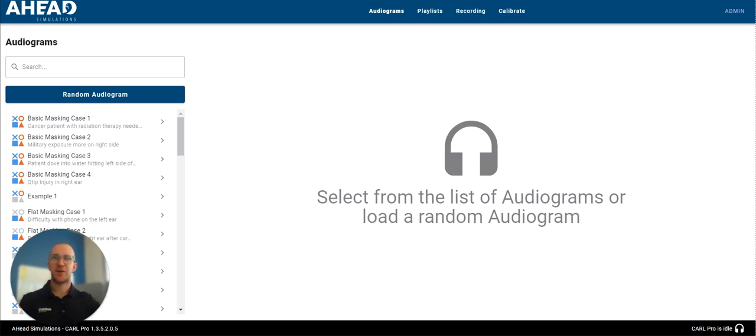Welcome back to another video in our Carl video series. My name is Rob from Ahead Simulations, and today we're going to be walking you through how to create your own audiogram inside of Carl Pro.